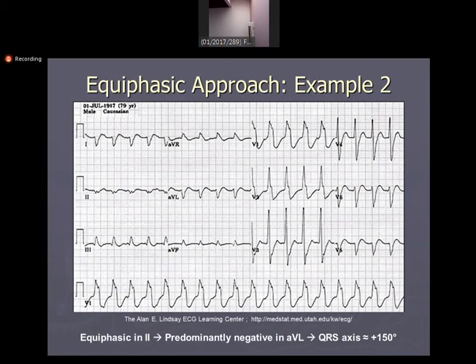It is a very easy and universal method. Whether the heart is regular, irregular, bradycardic or tachycardic, whatever the rhythm, you can accurately calculate the heart rate.